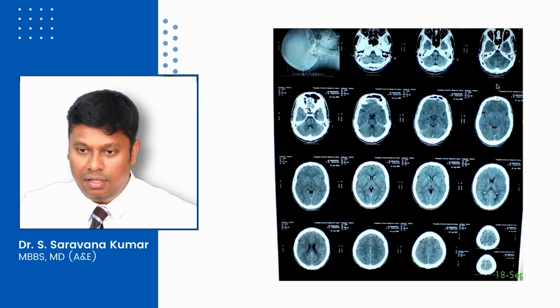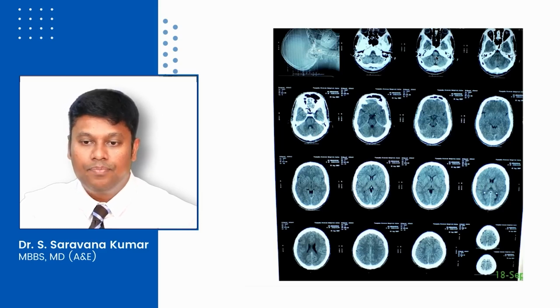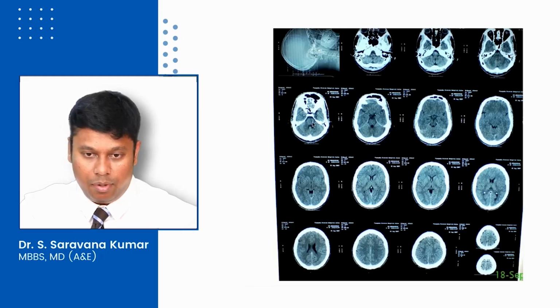Where is pons here? Probably number 4 and number 5 here, because that's where I could see a middle cerebellar peduncle. So this is pons in the center, this is pons in the center. So that means this is my medulla, cerebellum, cerebellum here, and here you can see pons, middle cerebellar peduncles, cerebellum, pons, middle cerebellar peduncles, cerebellum.